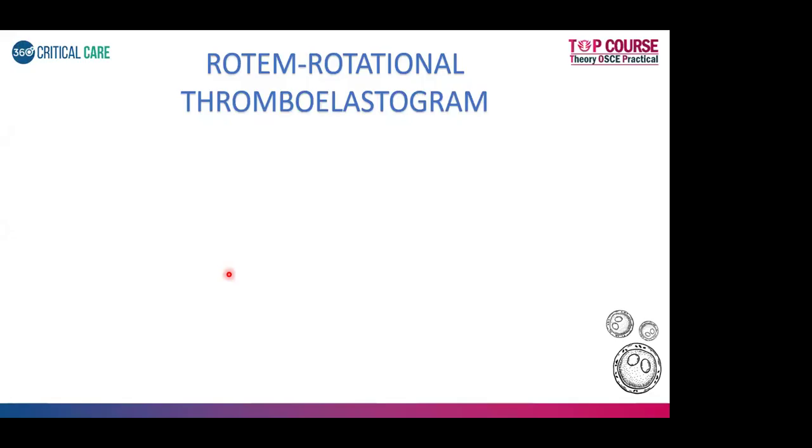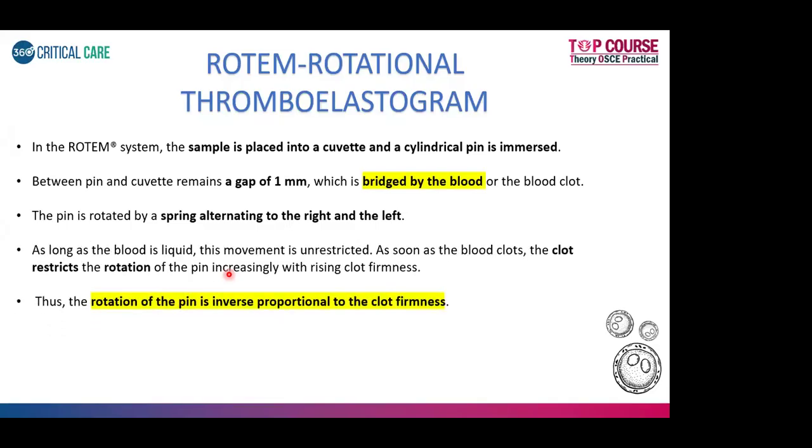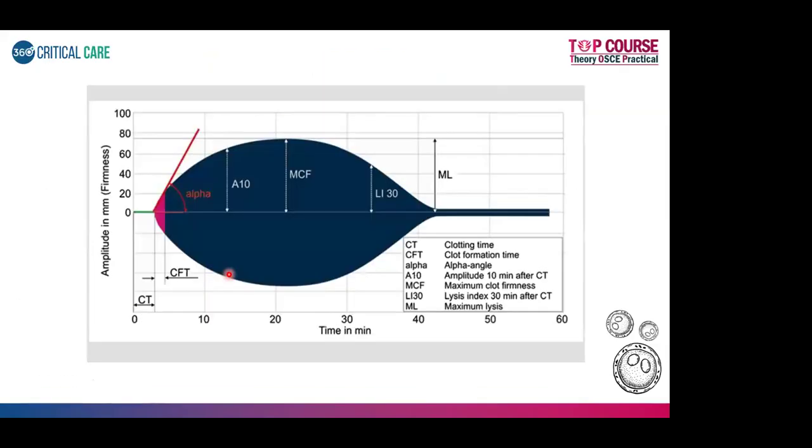But ROTEM becomes a little more complicated because it has a lot of other terminologies like INTEM, EXTEM, HEPTEM, FIBTEM, APTEM. Correct? So few centers who practice cardiac surgeries and liver transplant will have this graph. So it might be overwhelming, so I'll go in a systematic way. You can listen if you've not understood or if you have not used this till now. Similar to what you see in TEG, the same terminologies will be here also.